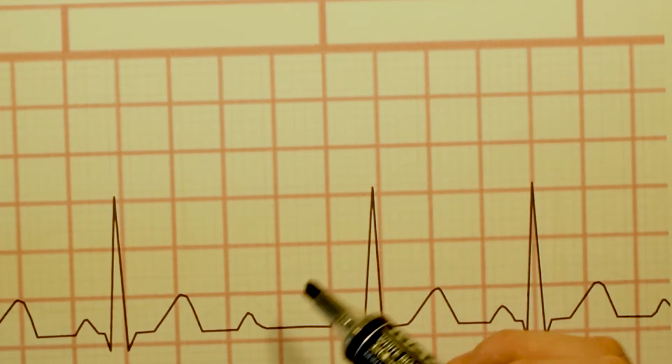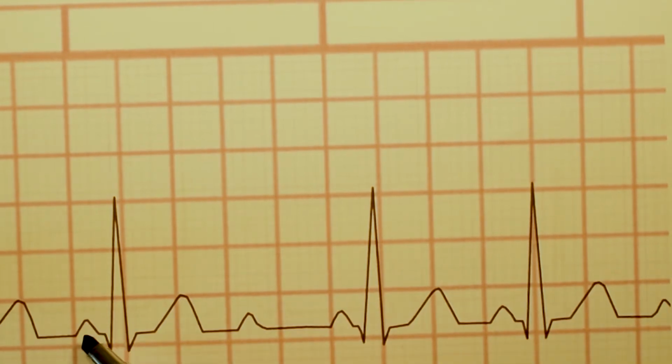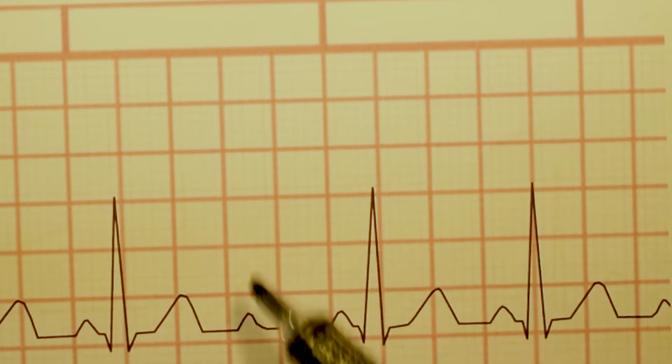So what's going on here? All right. The P wave is only 3 little blocks long, so that's absolutely normal. The QRS is 1, 2, 3 little blocks. That's also perfectly normal. The T wave looks normal. So the QRS is not broad. P wave is there, so the atria is firing. But what we're seeing here is, do we have a P wave before every QRS and a QRS after every P? It's a P, QRS, P, and then nothing.